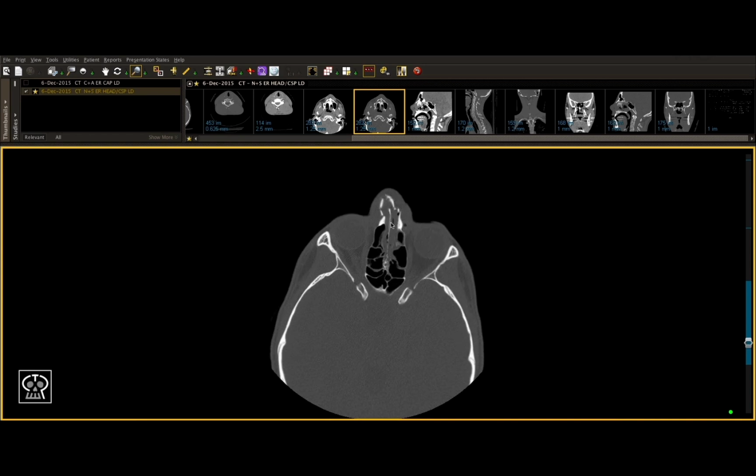Inferior to this, we see our bony part of the septum. And as we can see here, there's a fracture in the septum. The septum is not a piece of anatomy that we have talked about previously. However, it's very important to always look at it radiographically and clinically because there can be certain features that warrant immediate attention, for example, a septal hematoma.